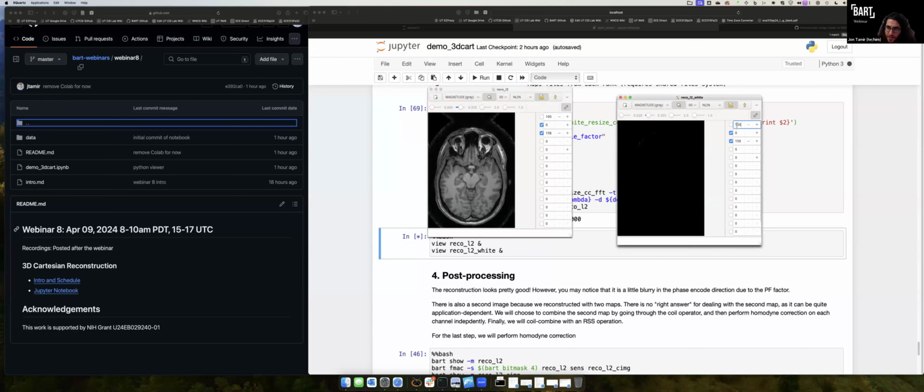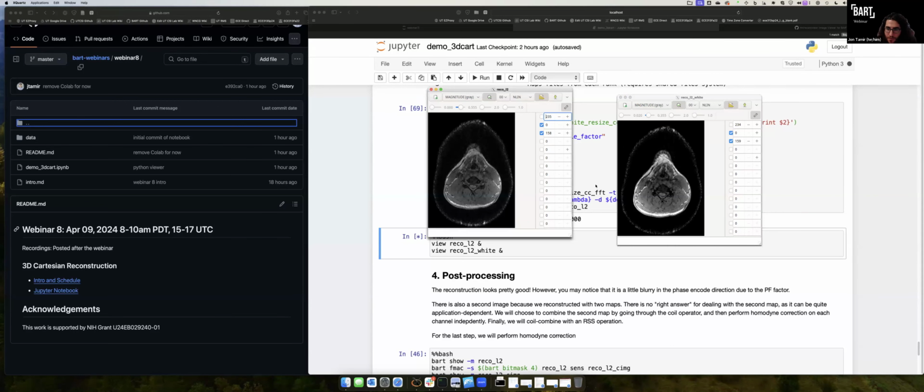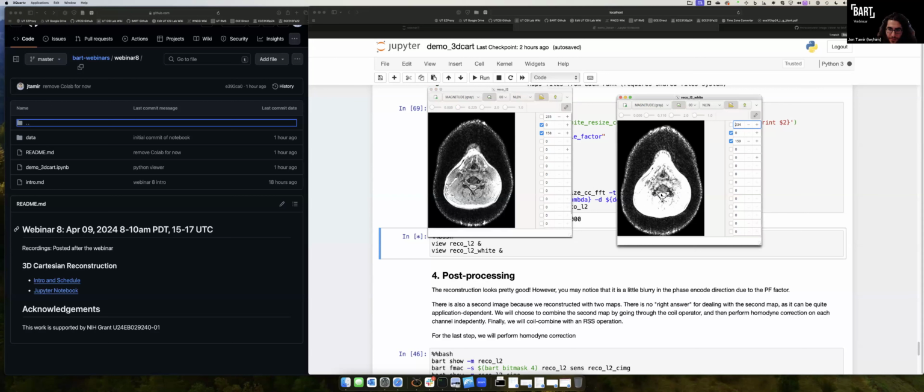But as a general rule of thumb, I would recommend noise pre-whitening because it's kind of a free operation that only can help your data. It doesn't hurt. So I'm just looking around to see maybe the edge slices have more noise amplification in one versus the other. Yeah, not too bad.